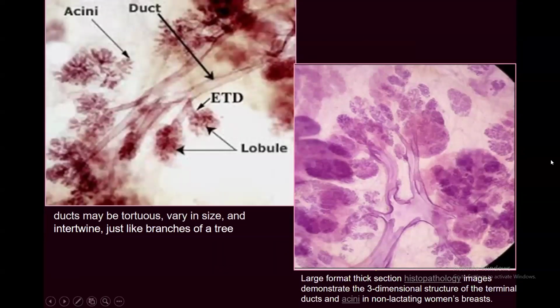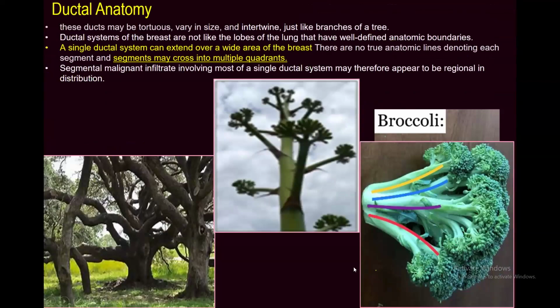So if we have cancer here, it can go posteriorly and at the same moment can go anteriorly, to the right and to the left. If I have cancer here, it can go through this duct to that level, and can go to the right, or here to the left. So I have trees like these, these major ducts, and each duct has segmental and subsegmental ducts.